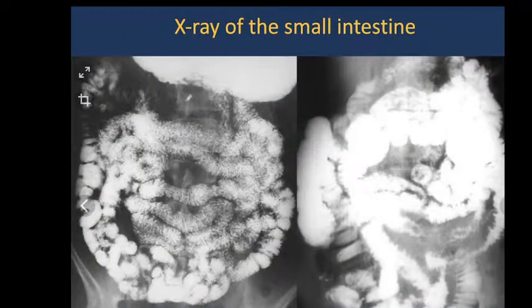Here is the barium inside the intestinum tenue, showing us the internal surface and different folds of these organs, very long organs.